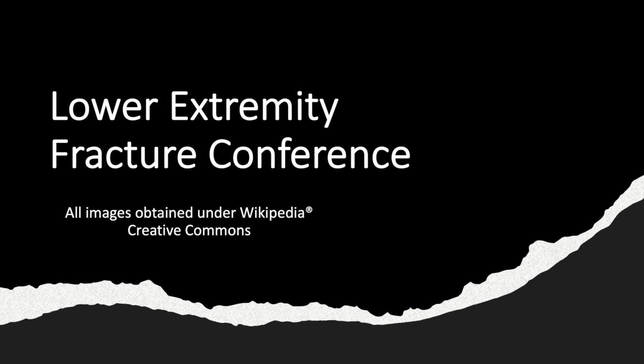My name is Quick, and today we have our guest lecturer back to go over another fracture conference with you. Much like the other fracture conference, we will be going over a template on how to read an x-ray and then let you practice it with regard to fractures of the lower extremity.